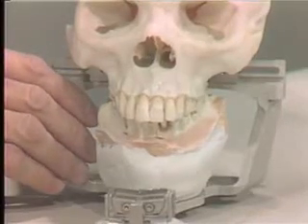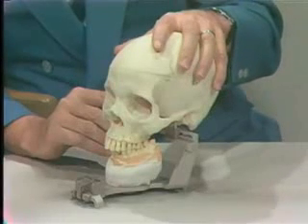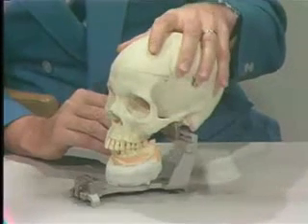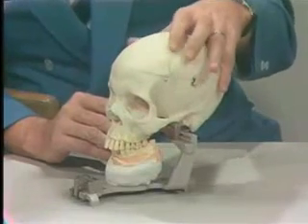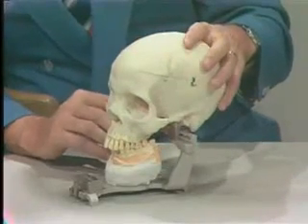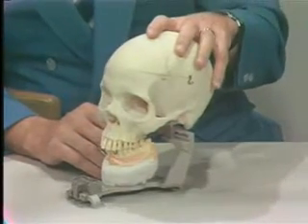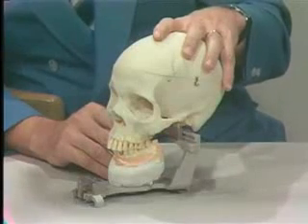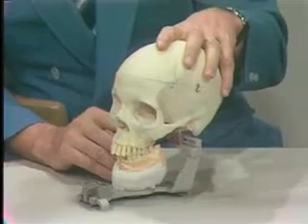Later you will be told exactly how to do this, but we'd like to tell you about the two types that we generally use: the Snow face bow, which is an averaging type instrument, where you use an arbitrary hinge axis and transfer that to the articulator. You also have a kinematic face bow, which may be a little more accurate, where you might be able to locate the true hinge axis. But the main purpose of the face bow, of course, is to relate the maxilla to the joints, or to the condyle.